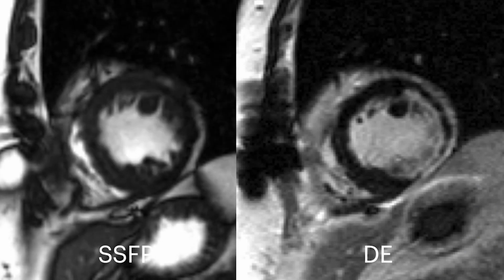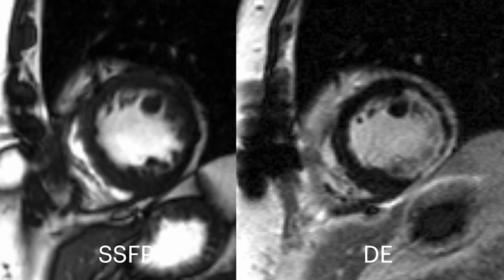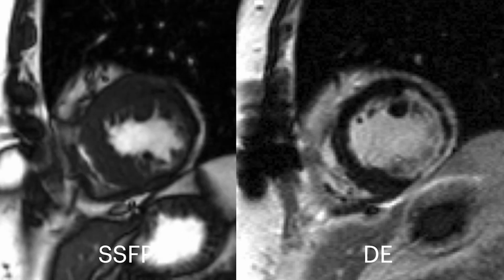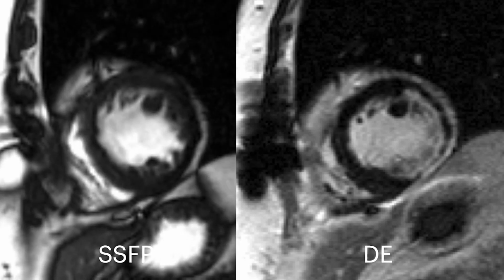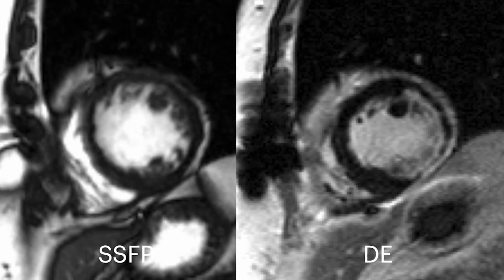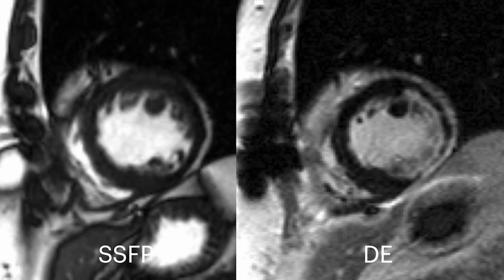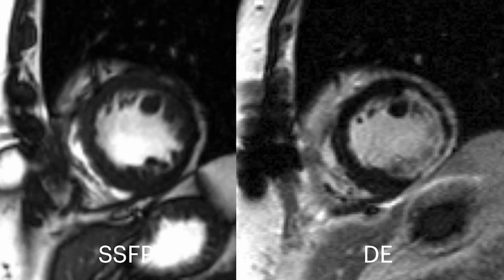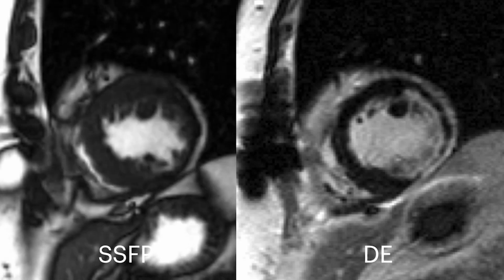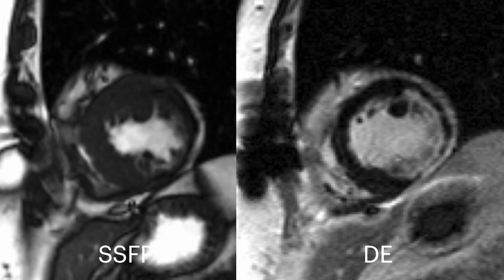And what we see is, wow, there's actually pretty abnormal subendocardial delayed enhancement with thinning of that infralateral wall, but we see that it actually extends more into the anterolateral wall and portions of the anterior wall. So it's a bit more pronounced on the delayed enhanced imaging. At any rate, now we need to look at our stress and our rest images.